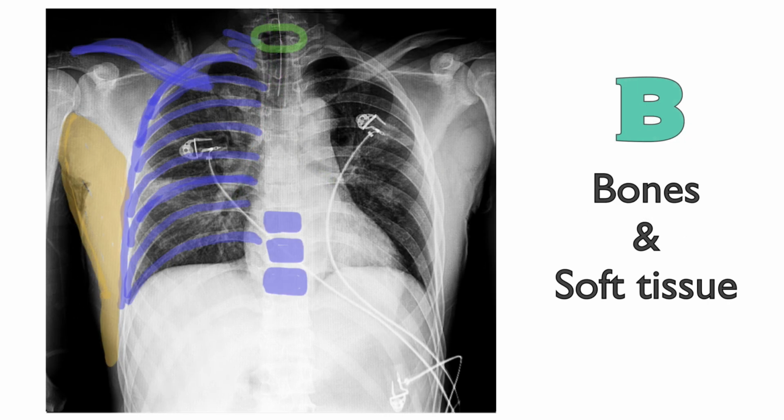Bone is the whitest areas on an x-ray, and air is black. The bones have been highlighted on the right side of the chest x-ray. T1 is located where the first ribs meet. This is identified with a green circle.